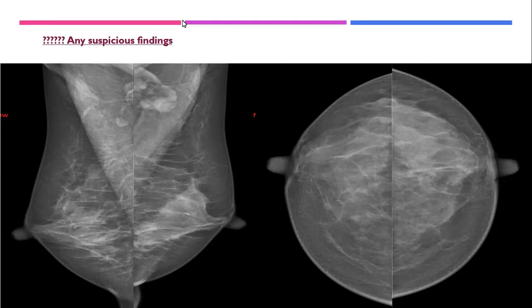Hindi said right. Where in the right side? There are multiple, in the medial part there are multiple, I don't know, these are masses or multiple. In the left also there is something central, just at the level of the areola, at the center here, and towards the posterior also, and here. And in the right, in the medial part, I can see small areas here.